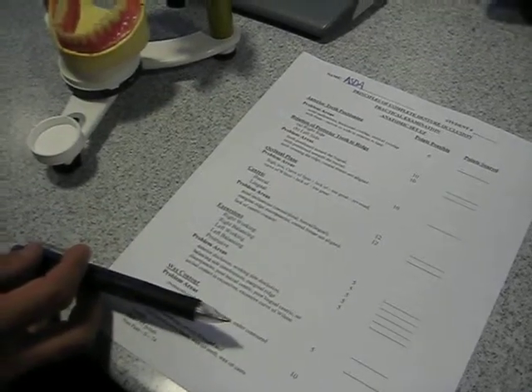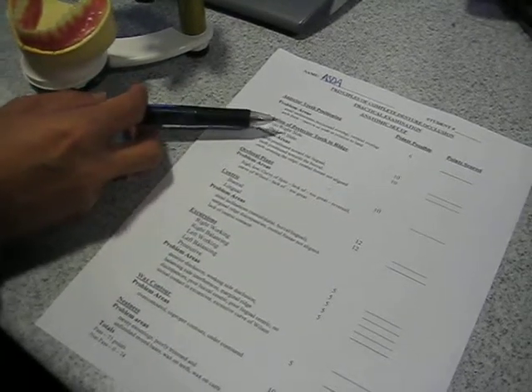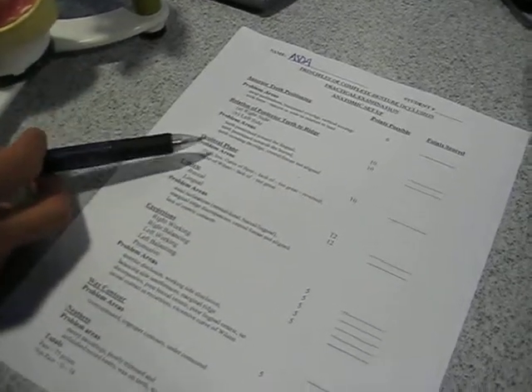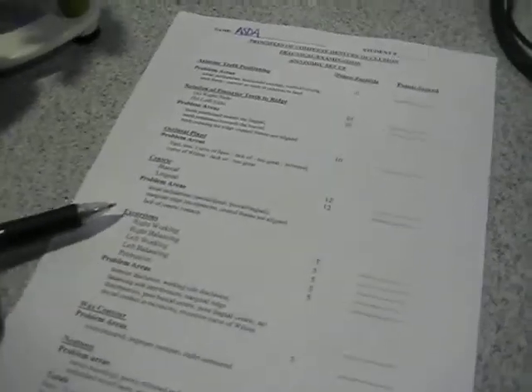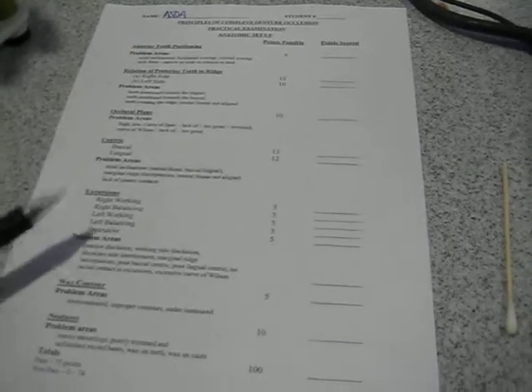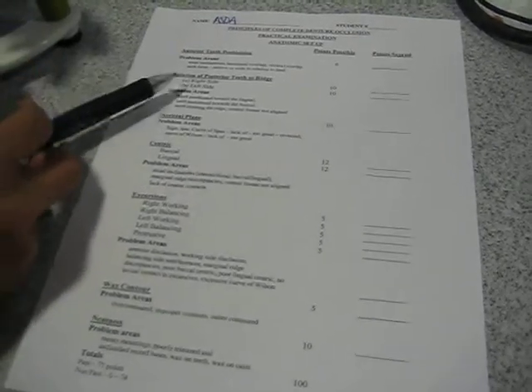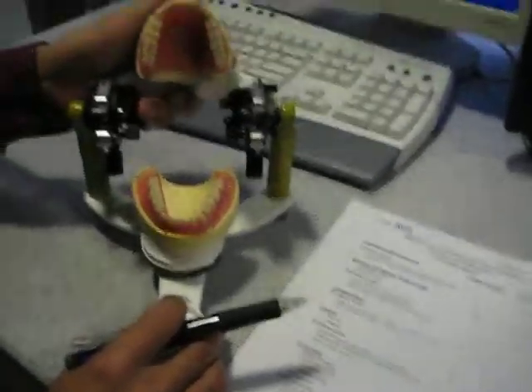So, for example, if the relationship of the posterior teeth to the ridge is off, or the occlusal plane is incorrect, it makes it very difficult for you to get all your points on the excursive positions. Okay, and the same is true with the anterior teeth in relation to where the posterior teeth are going to be set up. So let's take a look at the setup. It's a very nice, neat setup.